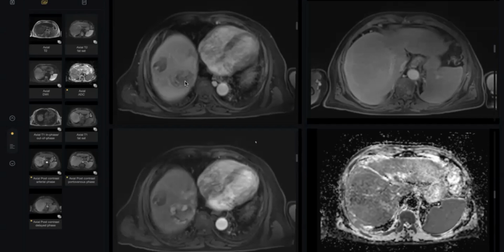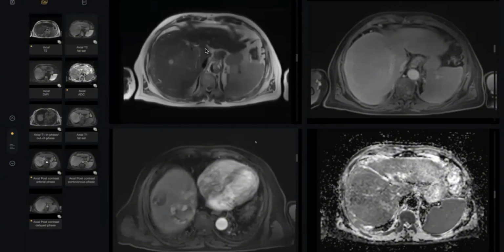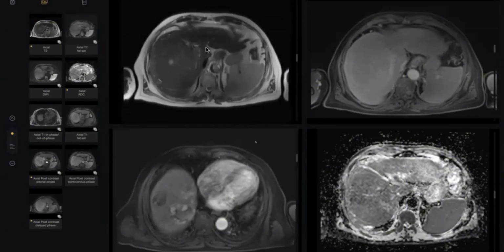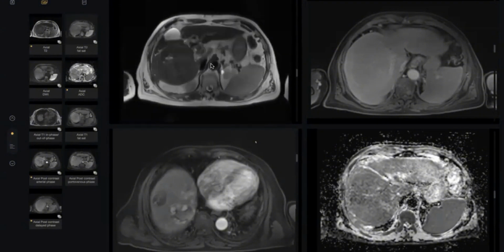And they contain a necrotic hypointense center. Look in the T2, it will be cystic. Central cystic changes. The key here, not the large lesion by the way, is the smaller lesion. Another point of difficulty is the regular border of the liver and the homogeneous parenchyma.